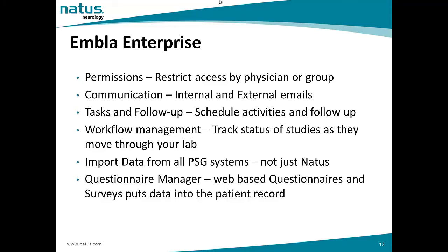With Enterprise, we can also use the questionnaire manager to create web-based questionnaires and surveys, so that when the patient comes into the sleep lab, they can fill in the questionnaires online, and all these results will be saved into the database under the patient's profile.